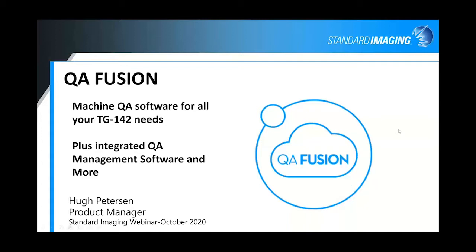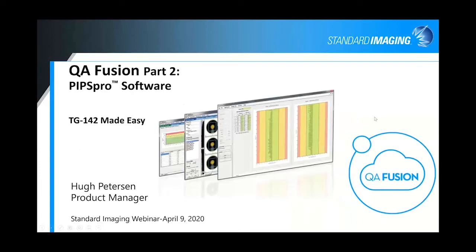Like I mentioned, today we're going to cover the second part of it, which is PIPSpro. And we like to think of it as TG 142 made easy. It covers a number of different tests for TG 142, and you can customize it as well to suit your specific needs for your own protocols.